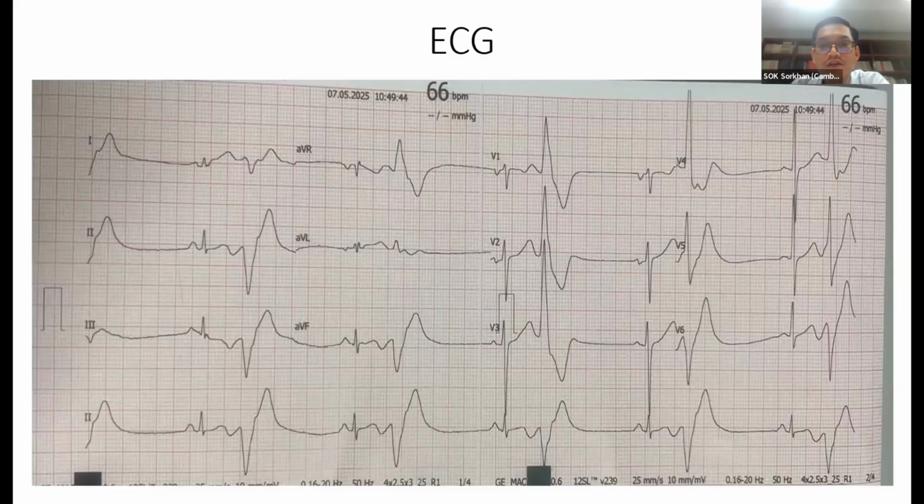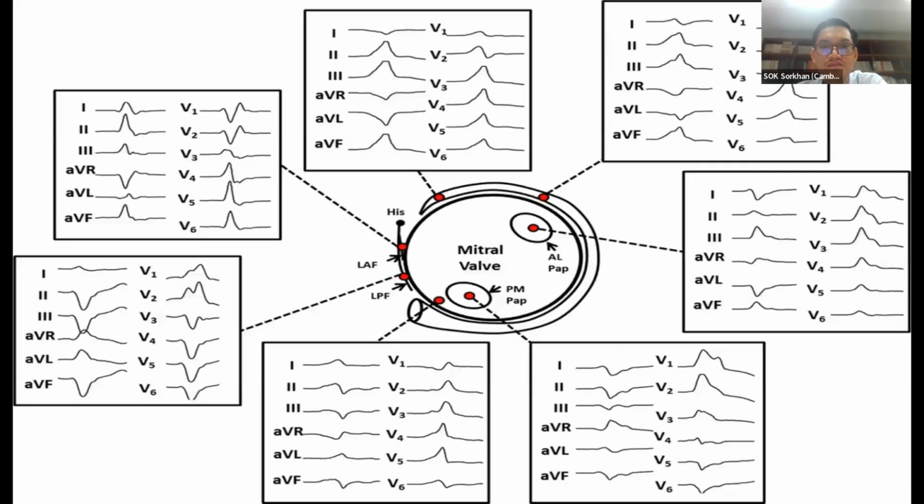So this is her EKG with sinus rhythm, but with a lot of PVC by bigeminy. The PVC is from the left side, positive in V1 and negative in inferior leads, so we think it is from the inferior of the LV. And we found the location of the PVC comes from the papillary muscle, from the posterior papillary muscle. The same morphology in EKG, clearly.